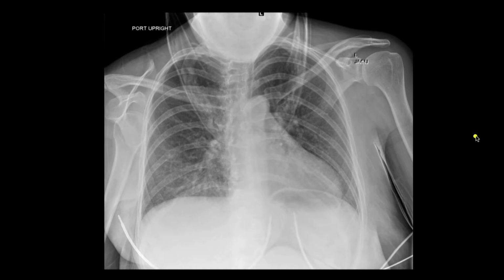This patient, again, you're looking around at the chest, the patient's come in with trauma, looks relatively good. You're checking the scapulae, the clavicles, and yet when you come to the right shoulder, you can suddenly appreciate that here we have the humeral head, and that should be articulating with the glenoid, and so the patient has actually got an anterior dislocation of the shoulder.